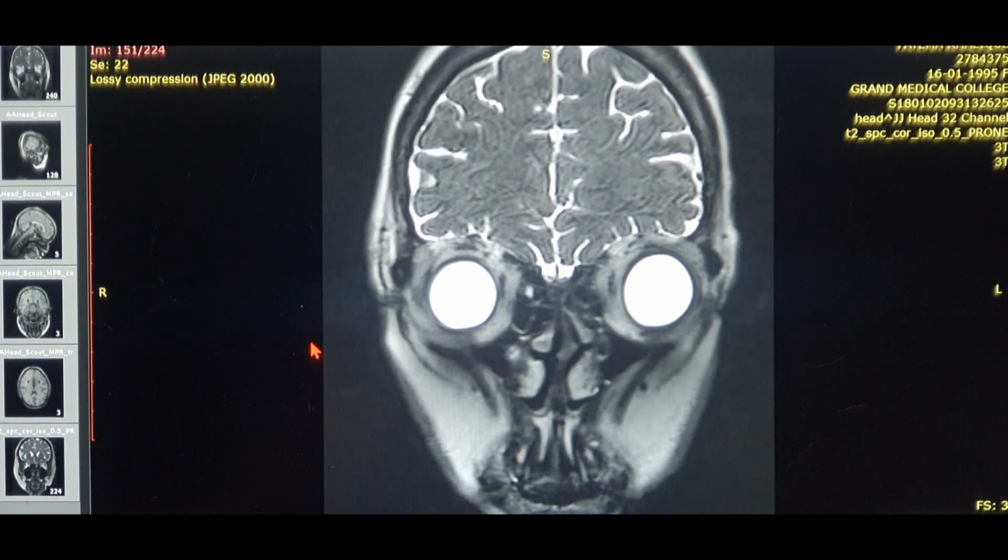The only disadvantage of the MR cisternography and the CT cisternography is that the leak can be detected only if it is actively leaking from the skull base into the nose. If it is not actively leaking, it will not show up on the MR and the CT cisternography. That's a huge disadvantage of that. So this patient, I guess, did not have the leak at the time of the cisternography, so it did not pick it up.